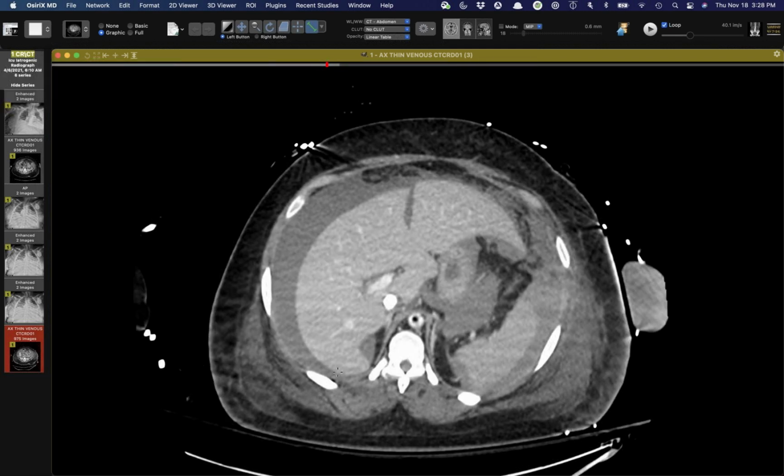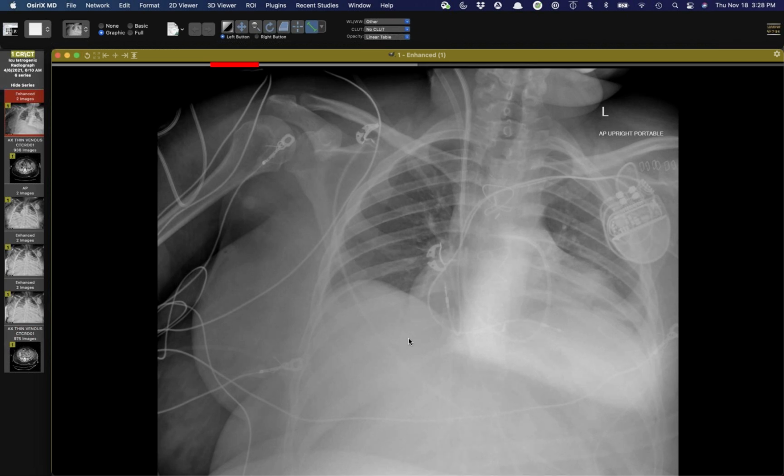But there's a trend in our place to go to Impellas rather than intra-aortic balloons. So we're not putting in as many intra-aortic balloons as before. I like that. I mean, we're still doing them, but I like that approach because, clearly, these weren't designed by radiologists since they're nearly invisible.